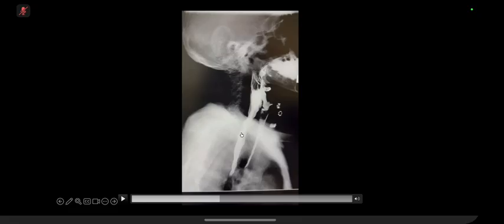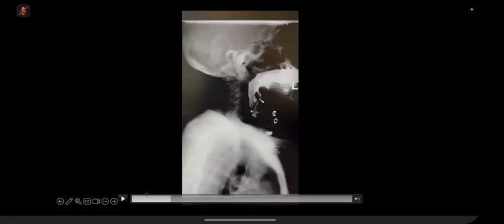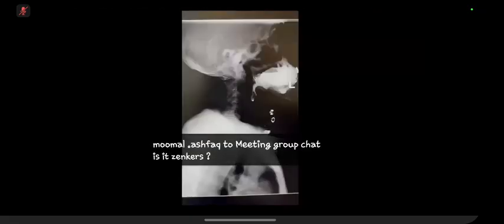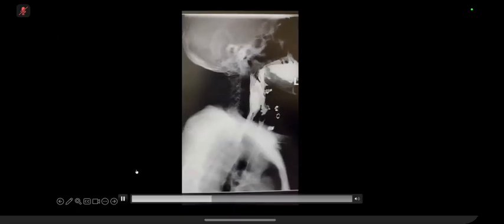What happened to the patient that he's having this kind of aspiration? If we saw the previous images, they have already removed the diverticulum. You couldn't find any fistulous communication, but the patient is still having aspiration, and the patient is 84 years old. So what could be the possible causes of this reduced motility of the epiglottis, which is covering the windpipe? Can you think of any cause?